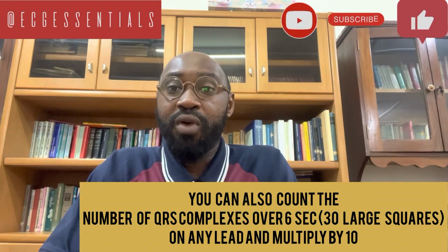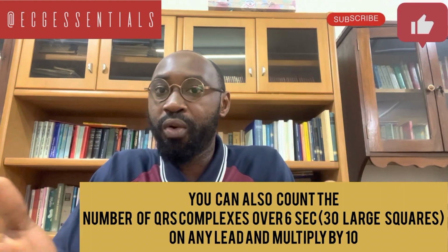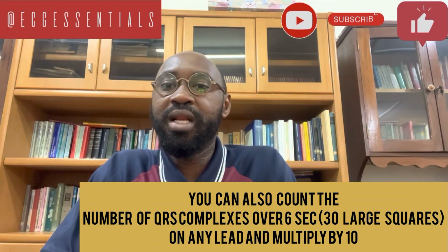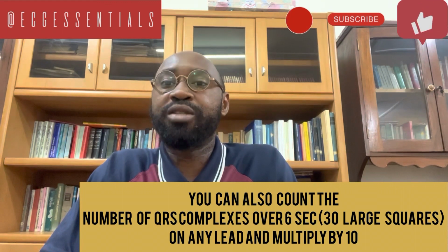So for an irregular rhythm, in a nutshell, look at the rhythm strip, usually lead 2, recording over a period of 10 seconds, and multiply the number of R peaks that you count by 6, arriving at the average heart rate.